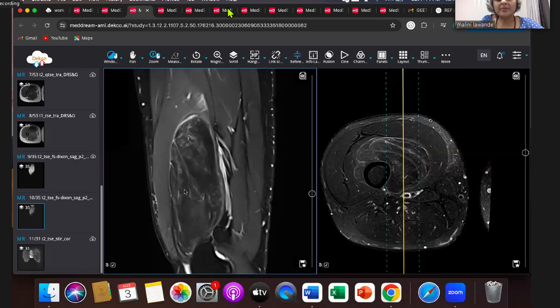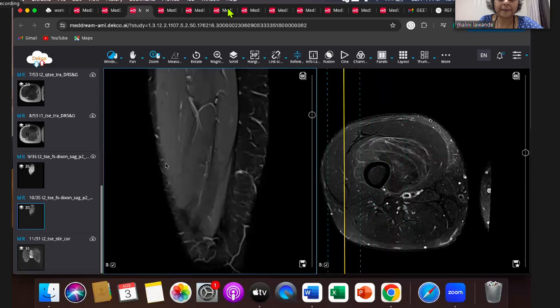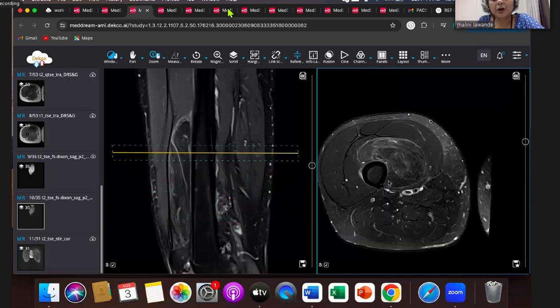Having said that, you may sometimes have just a lipoma, especially in locations like the back. Because of trauma, because of lying down, there is trauma there, and that can lead to fat necrosis. It can lead to some edema, hemorrhage there. So you may see very small areas of these changes in lipoma also. But this turned out to be an atypical lipomatous tumor. But if there's any doubt, any solid area that you see, then you should raise the possibility of a liposarcoma and target the biopsy to that particular location.